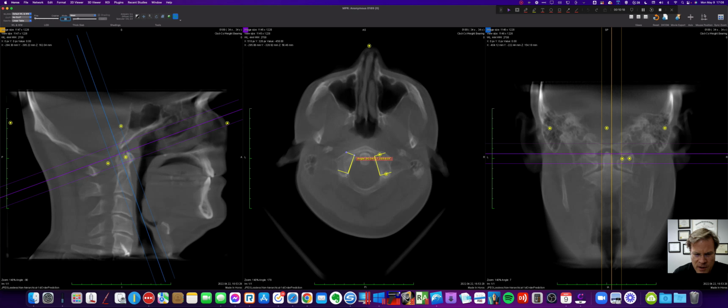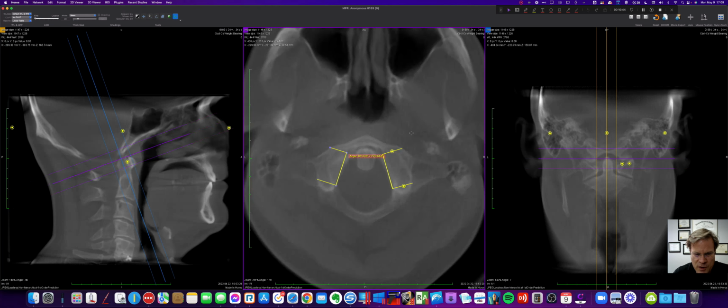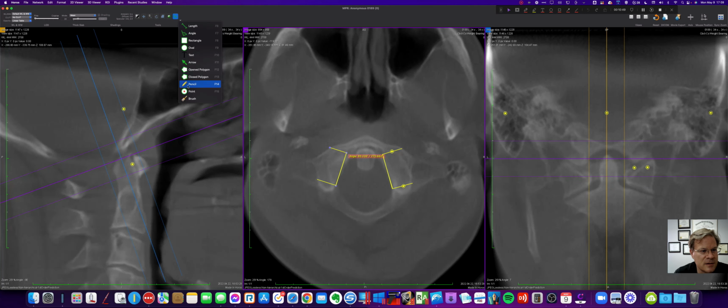All right, I'm not too happy with this down here. Let's get that right in there. Good, we got a 92, so I'm going to bring that in just a hair. You may say we're nitpicking. In fact, one of the things I can do initially is just bring that up. Okay, now let's bisect those two lines.